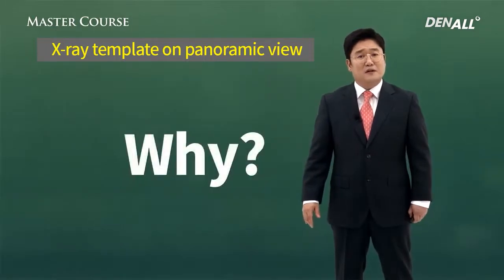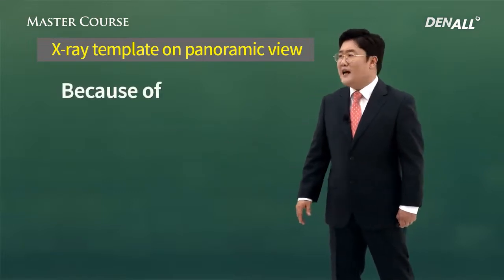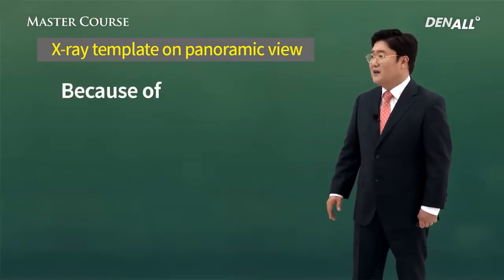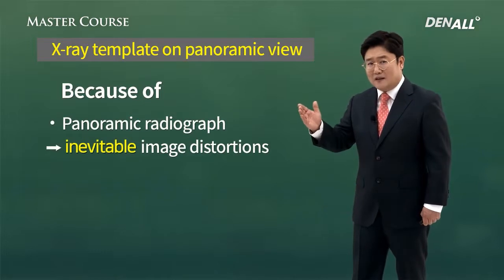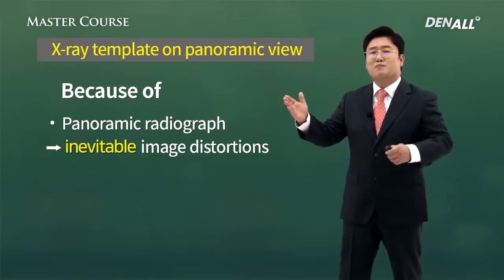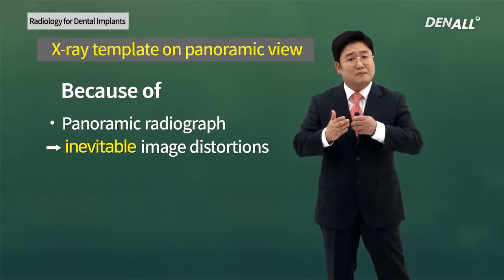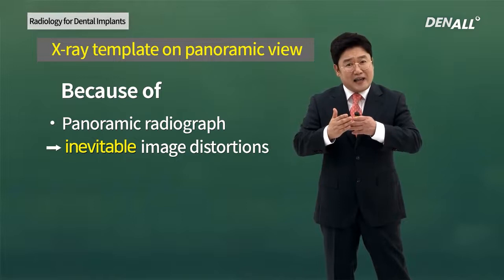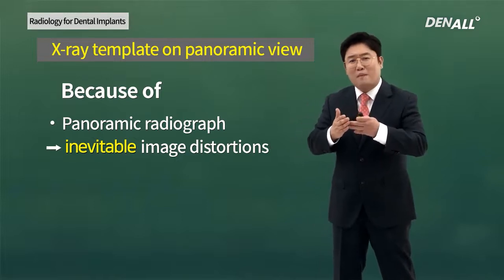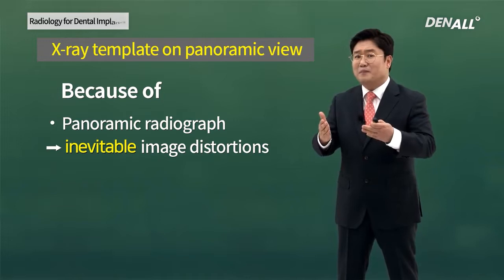Why? I believe you know, but because panorama is a spread out picture, therefore inevitable image distortions occur. The image size is changed from the original size.